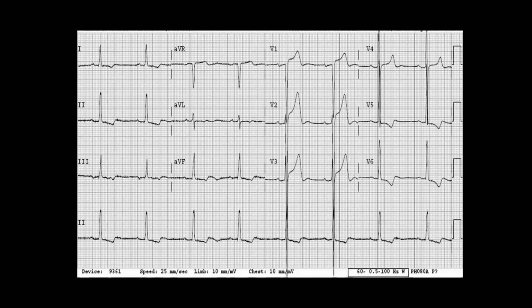And another example here, again, what do we see? Big QRS complexes, giant magnitude. You can see some pretty prominent ST elevation in V1, V2, and V3. But again, if you compare that to the overall size of the QRS complex, it is not clinically significant. For it to be significant, the ST segment would either need to be going with the QRS complex, or if it was going with the T wave, but to an excessive amount, which would be somewhere around 25% the overall magnitude of the QRS complex, then we would also say that's concerning.